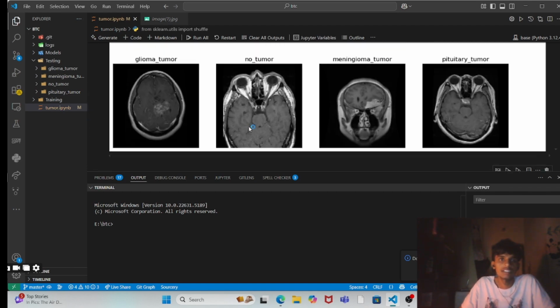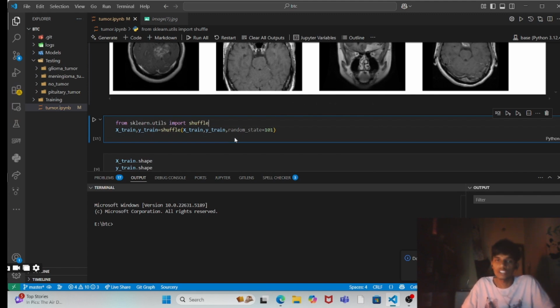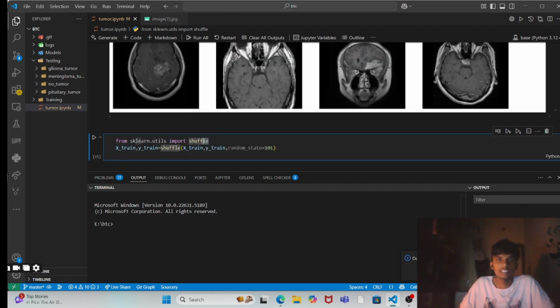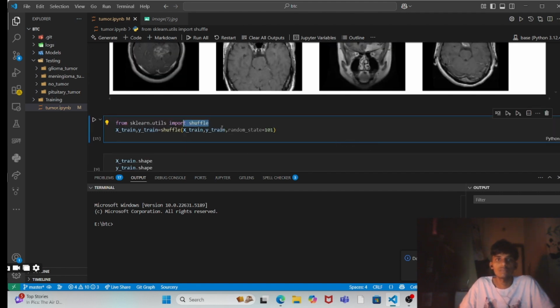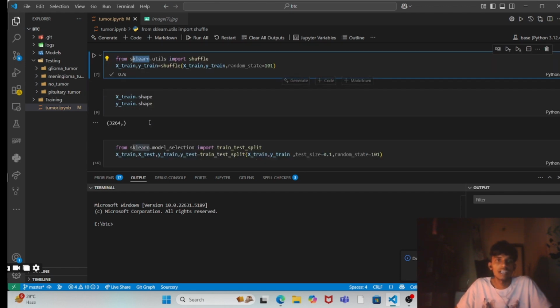And let's shuffle this, because if we won't shuffle, then when we train, the model won't learn, it will just learn things by heart like we do. Let's shuffle this, guys. Shuffling is important because the model must learn, it should not memorize things. It should learn from unknown things. So we have to shuffle the images. So I am training X train and Y train, which is now shuffled, and for this shuffle function we are using sklearn. And let's see the shape of the model.